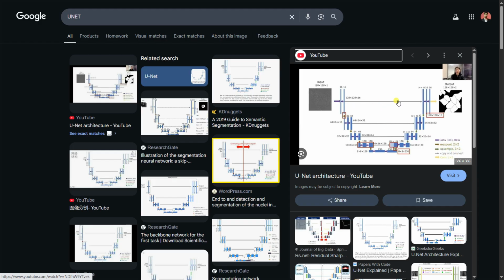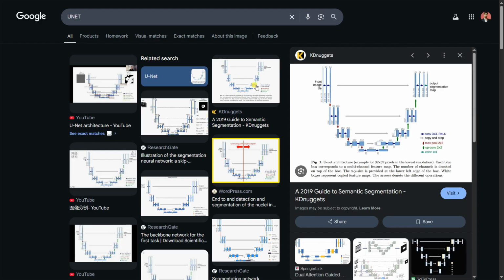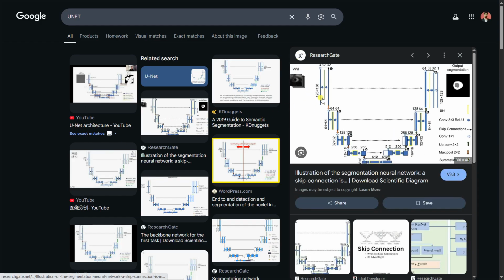See, it's called copy and concat, and this is count of 3 comma 1. This is the last one. Okay, for the segmentation tags. I just found it in Google. You can see more architectures, but the image size is not correct at all. In our projects, you can see it using 128 by 128, but the filter size is nothing but 32. Sorry, kernel size is 32.